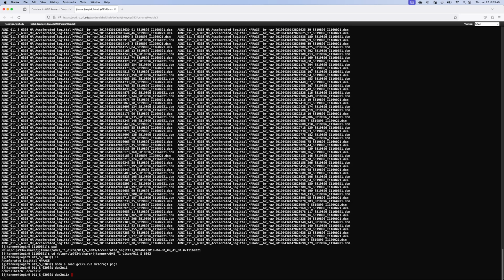But just to make sure that this converts in a way that makes sense, meaning we want this to be a compressed NIfTI file, and maybe we want to even rename the file, we're going to put a couple of flags, a couple of options first. So one of those is -z, so that's like a minus sign, -z, yes. And that is telling the software to use pigz, well in this case we're going to use pigz, to compress the NIfTI file. We want it gzipped, so it'll have a file extension .gz.